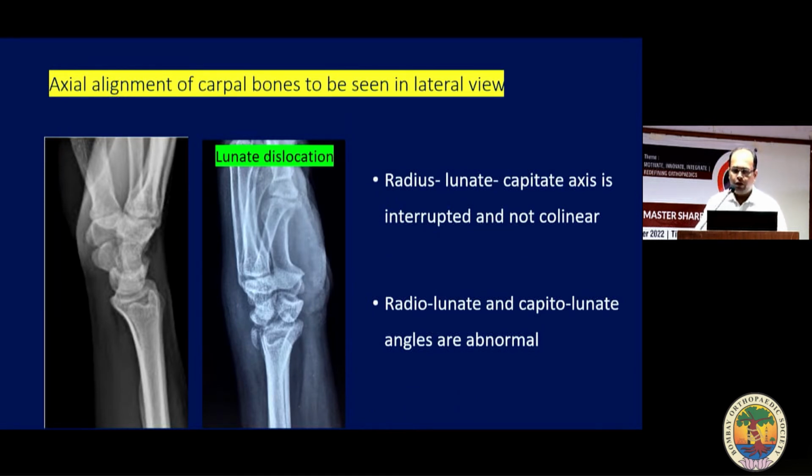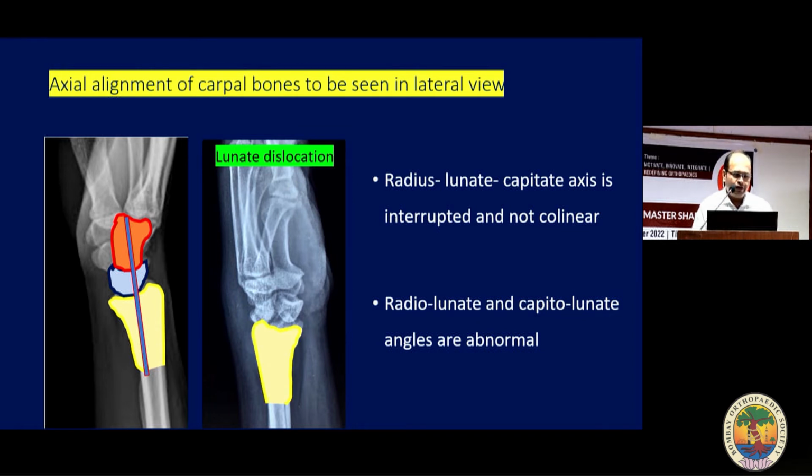Then what do we see on the lateral view? We have to see the alignment of the radius, lunate, and capitate axis, and if possible the third metacarpal, in the same line. So this is the distal radius, this is the lunate, and this is the capitate. Usually they are aligned in a straight line. But when there is any lunate pathology, then either the lunate is out or the capitate is out of relation. Here the capitate and radius are probably aligned, and the lunate is out of the picture, which means it's a lunate dislocation.